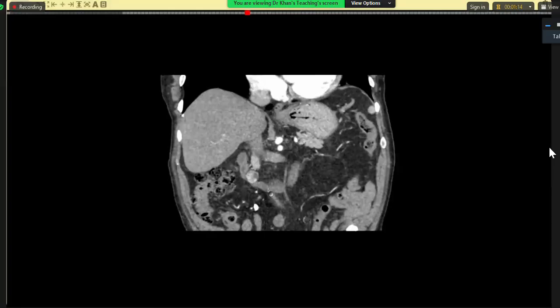So conclusion, madam. I'm suspecting that this is a gastric malignant process. And for the duodenum, I'm suspecting that this might be leiomyoma or part of GIST. Will it enhance like this? Not really. For leiomyoma, it will not enhance like this, but maybe for the GIST. Final. Give me the final diagnosis. We are out of time. Okay.